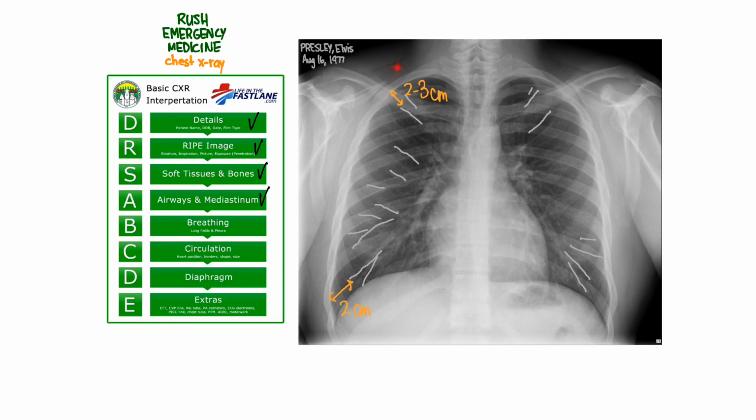This should be about 2 to 3 centimeters away from the pleural edge at the top and about 2 from the bottom. Now, when you don't see those vascular markings, and what you just see is very smooth, homogeneous black space there, then you should start thinking about a pneumothorax. And the pneumothorax can be subtle, so it could be hard to see, so you really got to be looking for it. And you'll probably see it best in the apices, meaning near the top, because air is going to be pushed near the top because gravity is pulling the rest of the lung tissue downward.